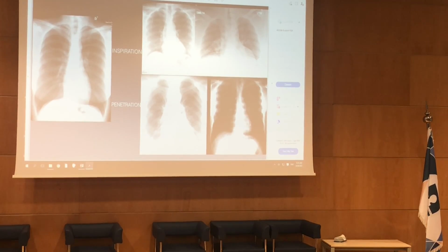Okay, when we see this, before we used to say that the patient is burned, right, because of the amount of radiation that actually went through them. So in both cases, you will see here that the spinal column is completely white. You are unable to see the intervertebral disc or any details, not like this one. So this is the normal X-ray. You have to see through the chest and through the heart. You have to see the intervertebral disc. Not completely, very obvious, but enough that you can detect large pathology.